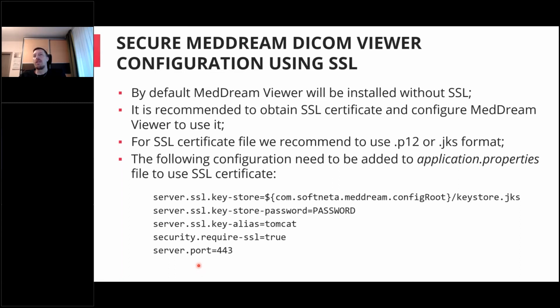Once you test it, we really recommend using the SSL certificate even for testing, if you have the option. Configure it, and if you have any questions or issues, just let us know, contact our support, and we will be ready to help you with this configuration.